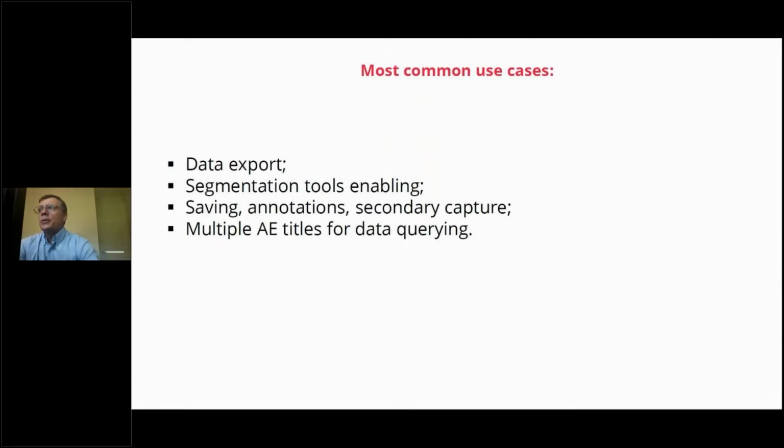Yes, now I will try to show the most common cases for the 7.9 version, where the new functions give new workflows, and we already got some questions and explanation requests from our partners.